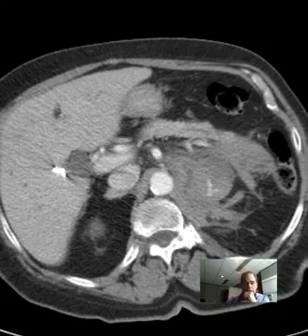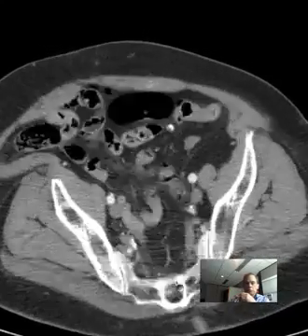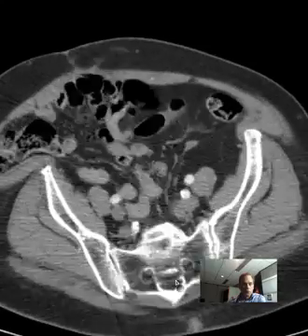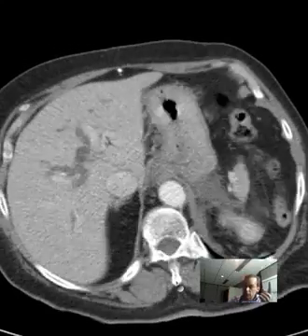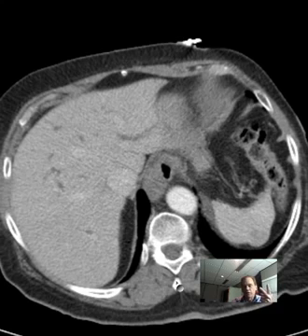Okay, now here we have a nice IV contrast enhanced study, CT abdomen and pelvis. Okay, there's your overview. So, 3 questions. 1, is there an abnormality? Yes. 2, describe the anatomy including its anatomic relationships. And 3, posit one or a couple possible diagnoses.